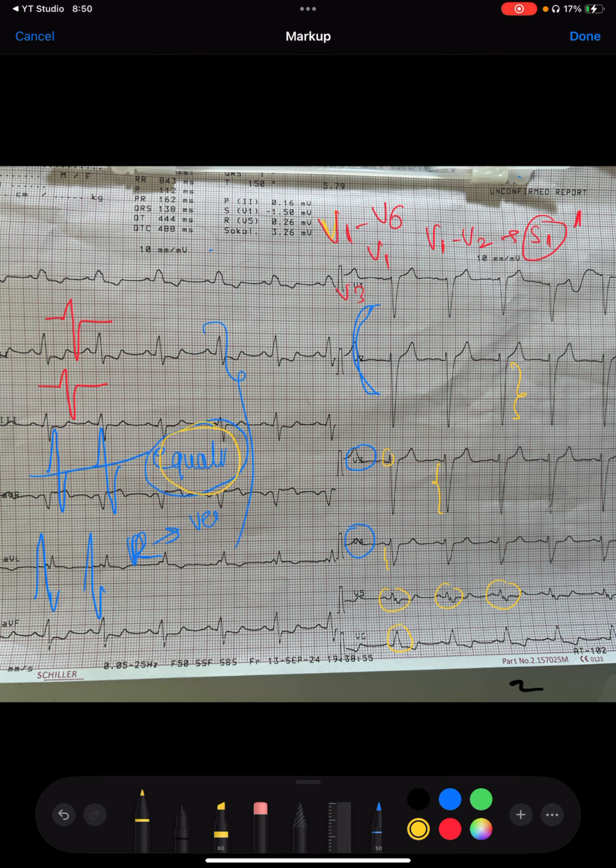It means R is there because of the ventricular contraction, the ventricular muscle mass. So if R is not there, it means ventricular muscle mass is not there, which means the contractility is not there. It means it is significantly damaged because of ischemic heart disease. So this poor R progression tells us that there is a high possibility of the patient having ischemic heart disease.